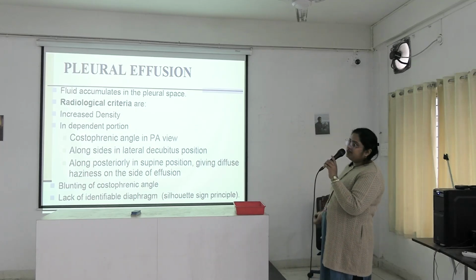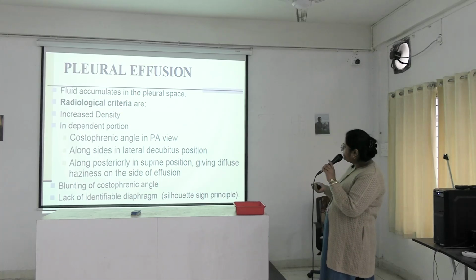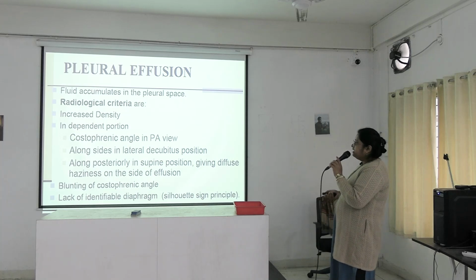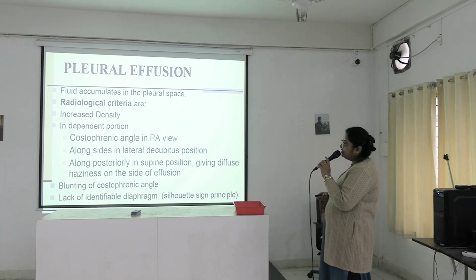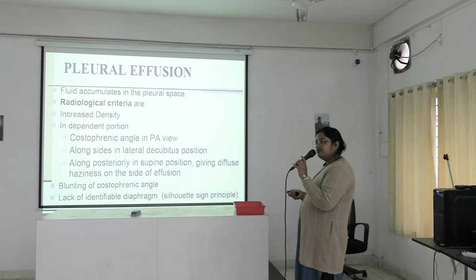And if the patient is lying in supine position, it will occupy the posterior pleural spaces. Okay, giving diffuse haziness on the side of effusion, and blunting of the costophrenic angle, lack of identifiable diaphragm. Silhouette sign is positive.